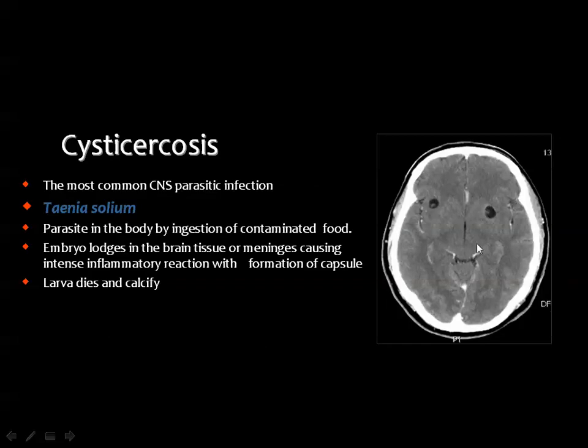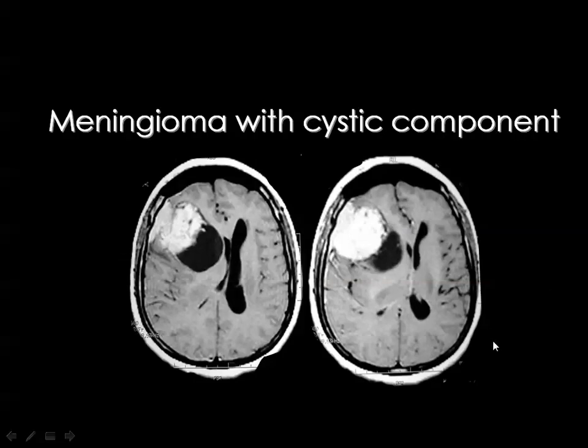And then this is the typical appearance of intracranial cysticercosis. It's a small cyst with an internal hyperdense dot that represents the scolex of the parasite, and this finding, which is typical for neurocysticercosis, is known as the cyst with central dot sign. Then we'll discuss cysticercosis in full detail whenever we are talking about intracranial infection. This is a parasitic infection resulting in multiple cyst-like structures.